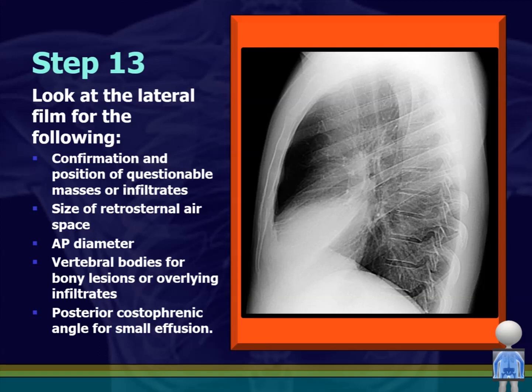This is specifically important when something is retrocardiac. If something is back here, and this is true of masses or other lesions, if something's right behind the heart, whether it's down here or even here, on a regular film the heart's occluding your ability to see it.